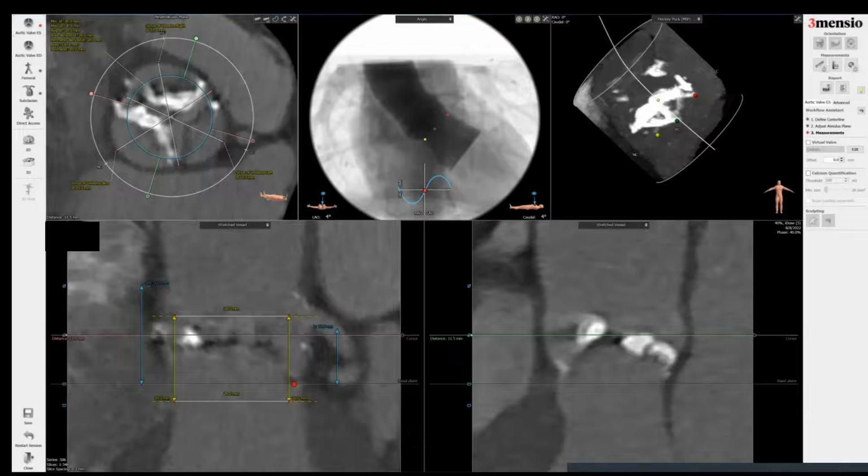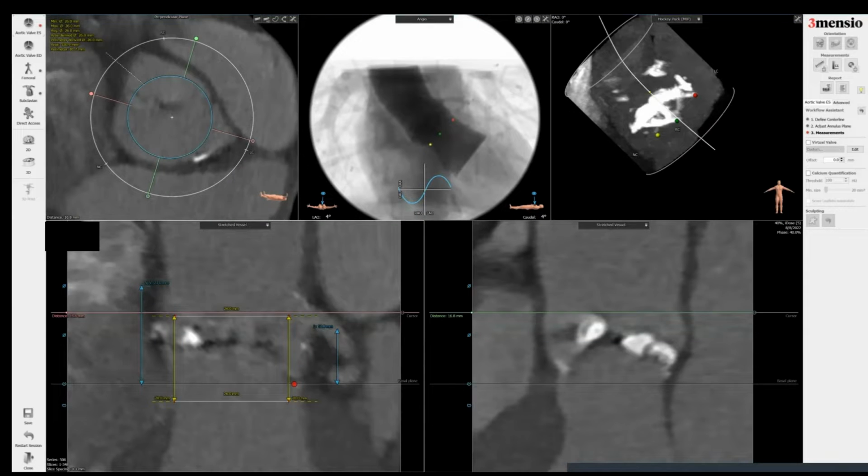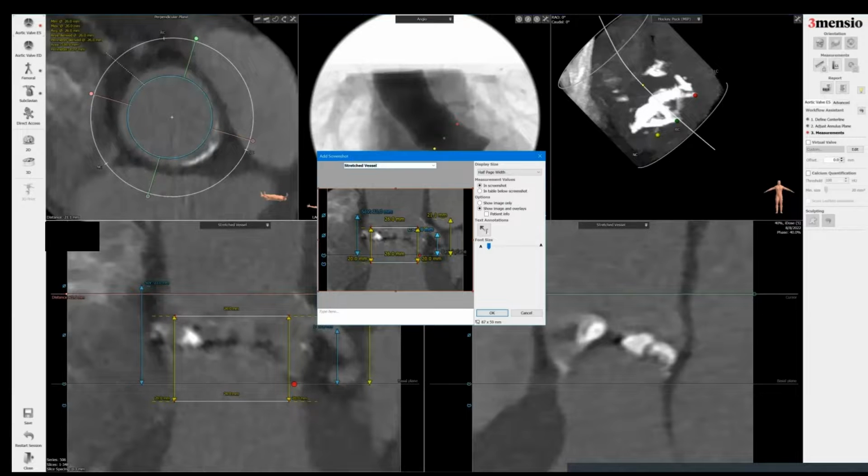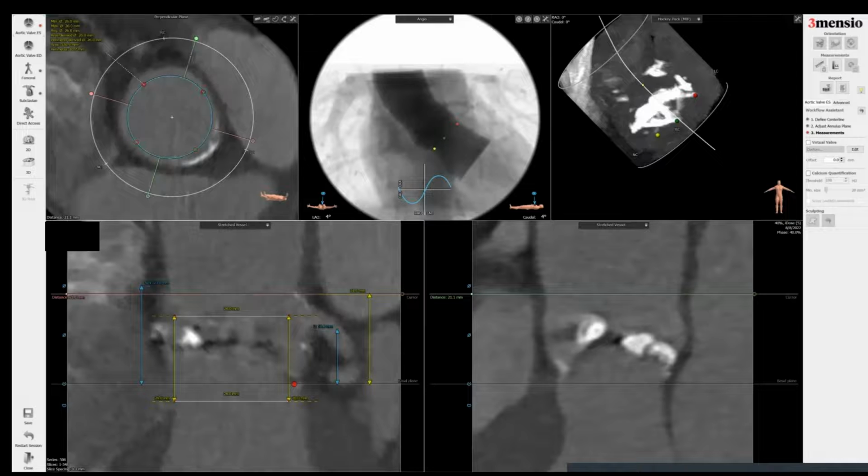Next, I'm going to show this here. You can see the left main. Now, sometimes the left sinus is shorter, like in this case. And then you go to the top of the left sinus. If you do right click, that's called measure from basal plane, and you can now look at the left sinus separately from the overall sinus. So I'm going to save the image here of this left main with the box here. You will be able to show all the numbers on this. And then I'm going to click sinus side left LCC just for description.